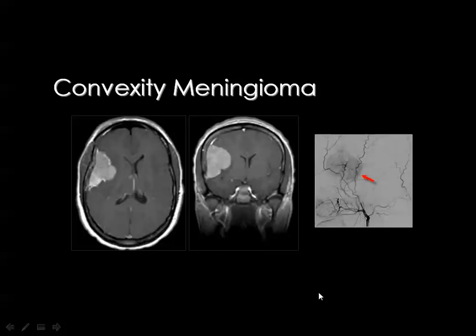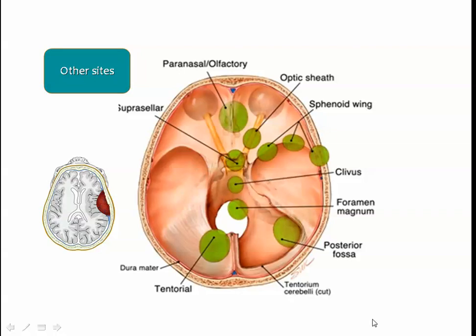based on the site of dural origin or dural attachment. And this is MRI T1 axial and the coronal post contrast, and you see the homogeneously enhanced lesion which is based to the dura on the convexity meninges. Then you call this the convexity meningioma. And before the era of CT and MRI, you used to have an angiogram which typically shows the tumor blush and the encasement of the vessels, which are derived mainly from the blood supply from the dural vessels.